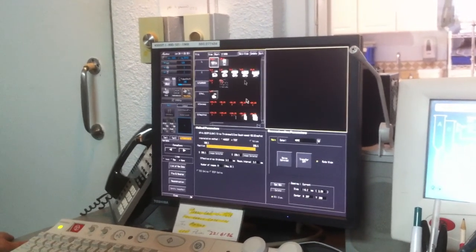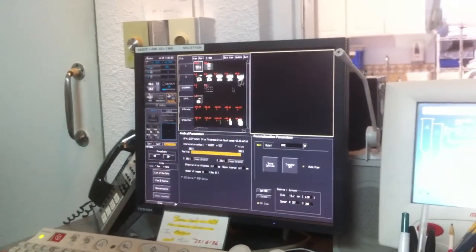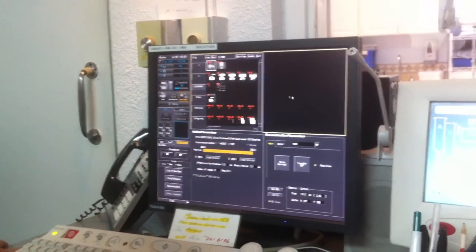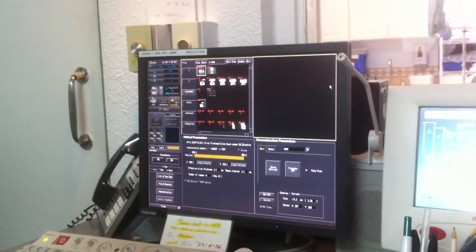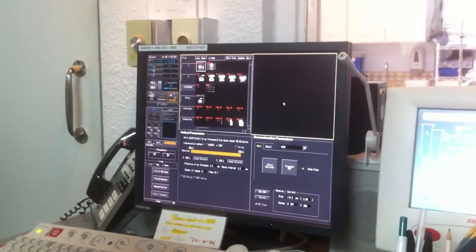I can still reconstruct it, but I'm going to reconstruct blindly because I don't have any reference images here at all. So I won't know really where to center or how big I need to be as far as correcting that data.